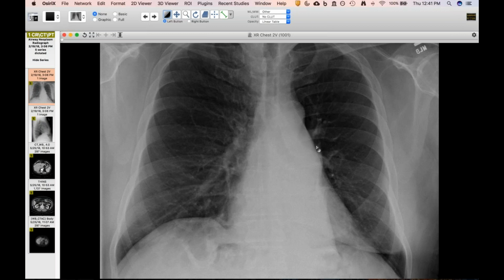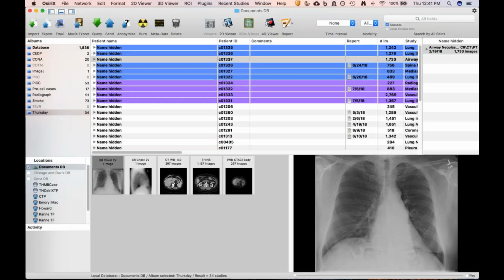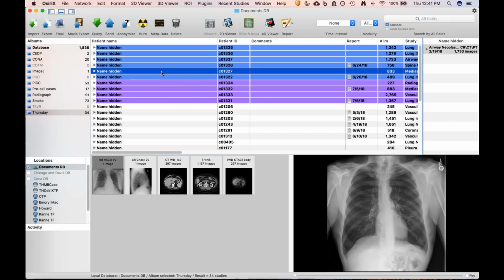Yeah, that's a good point too, with the left hilum being depressed and at almost the same level as the right hilum. And of course, yeah, you do have some of a flat waist sign here. I always find that more helpful in inpatients where they have acute left lower lobe atelectasis when you have another comparison to see what their heart used to look like. But you're right, that's there as well. And the left main bronchus is pointing more vertically downward than it normally would. So I think that's right. Okay. Yeah, so it's got more of like a J shape rather than straight across. Yeah. Yep. Good points.